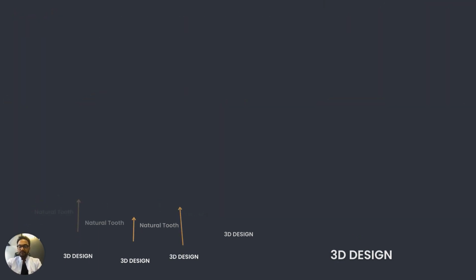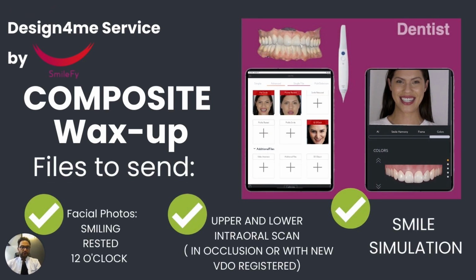Here, we recommend you use a case that is either additive or a patient who has just finished the ortho procedure, someone who does not have flared teeth, so that it can be a minimally invasive design and a minimally invasive restoration itself.